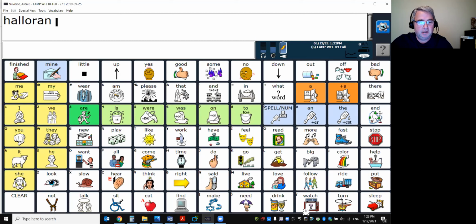But anyway, now you want every word to be spelled correctly and then to sound as close as you can to the accurate word. I'm actually going to end up giving you three uses for the pronunciation dictionary. Let's start with making a word look right and sound right, which an example would be my last name. So how do you fix a word's pronunciation if it doesn't sound right?